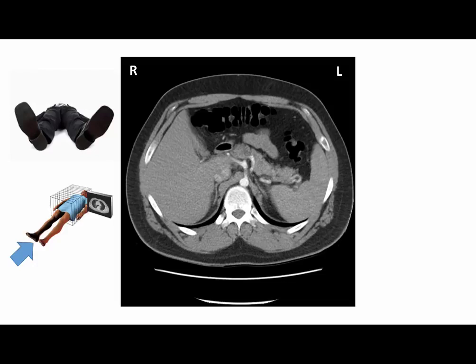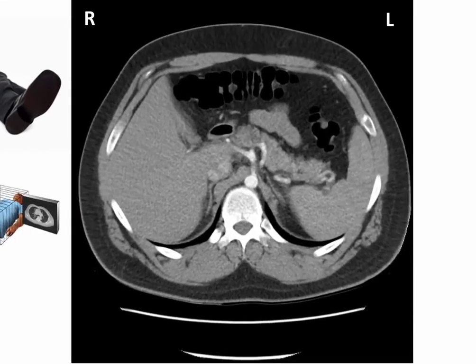Typically, contrast medium is an iodine-rich solution injected into the patient via an antecubital vein, which allows us to better visualize vessels. In this case, the medium was allowed to travel to the right heart, to the pulmonary circulation, the left heart, and then to the arterial system before the scan was taken. This allows us to see the arteries, so we say this scan was taken in the arterial phase. We will read this CT starting from inferior and moving superiorly.